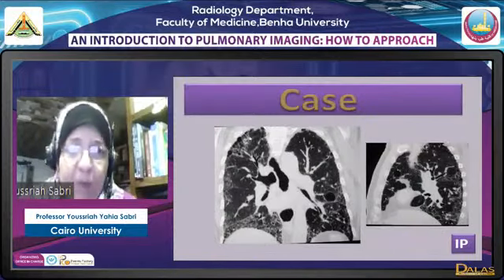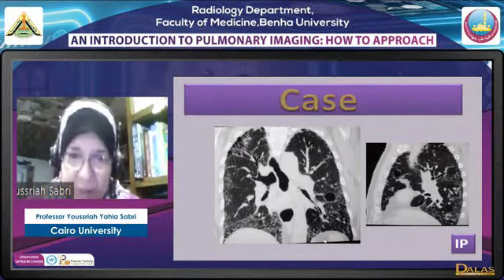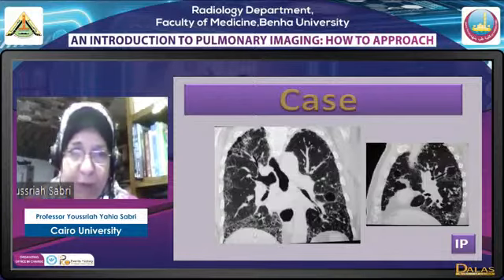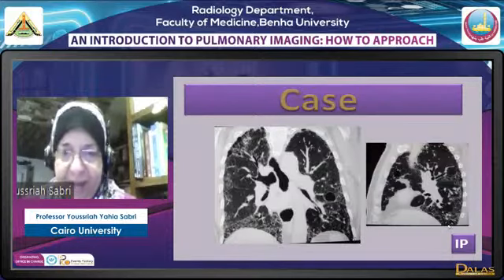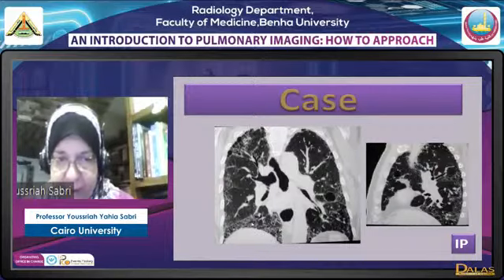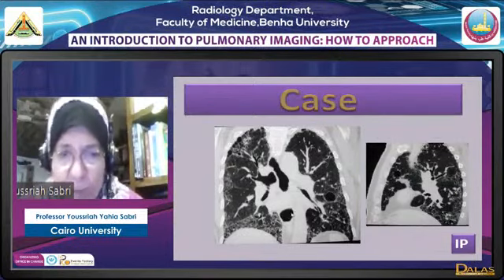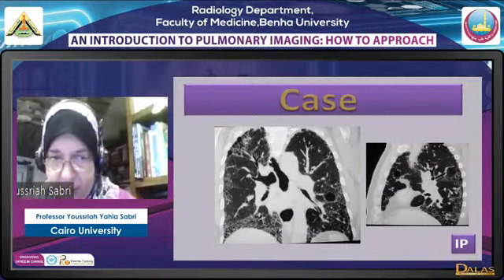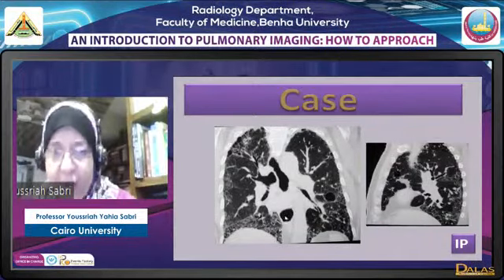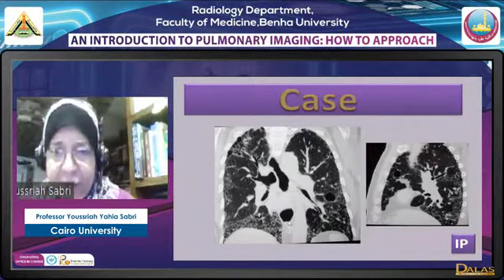In this case, we have again the bilateral, fairly symmetrical lesion with predilection basally and subpleural. We have subpleural predilection, predominant basal affection. Pleural recesses are classically affected. Okay, those linear structures inside are traction bronchiectasis. And in addition, we have this structure. What is this? This is a dilated esophagus. Okay, so this is an interstitial fibrosis with dilated esophagus. This is a case of scleroderma.